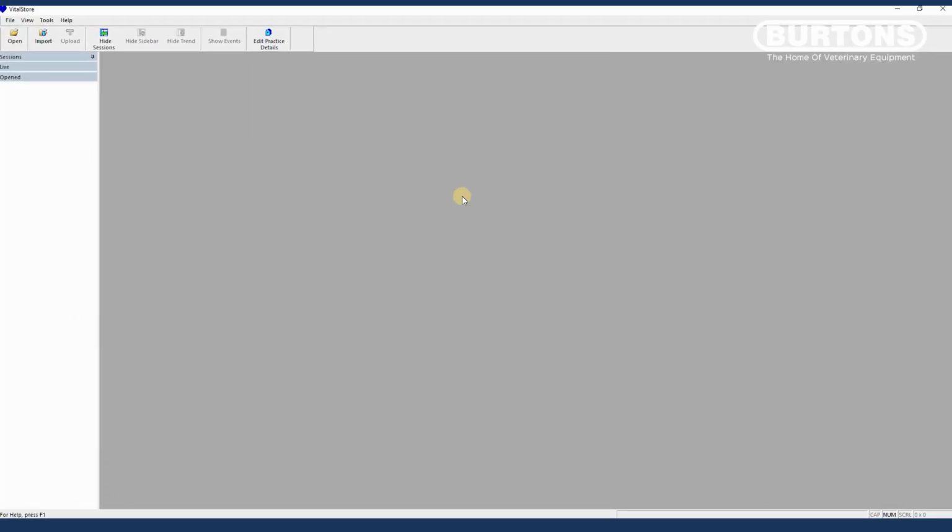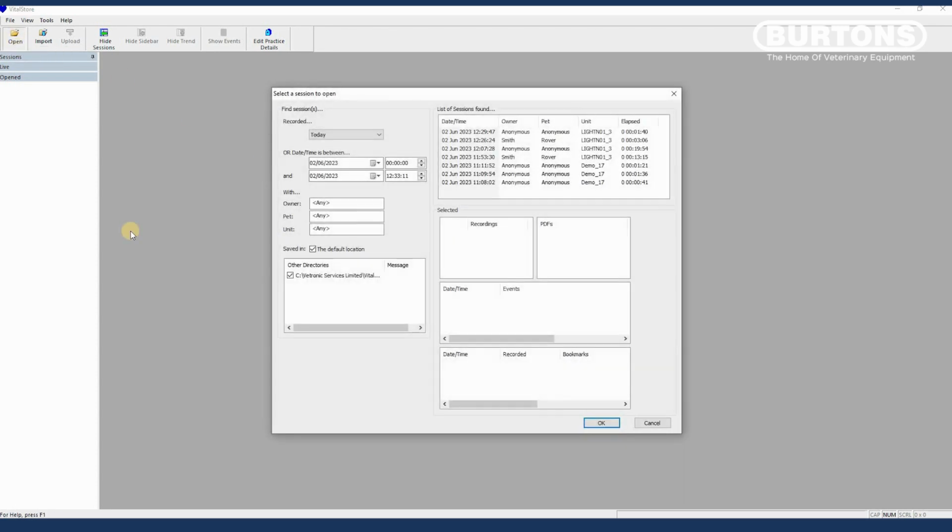And then very simply, it's an empty screen. You need to open a file to view it. So we click on open, and then by default we have all of the recordings for today. Here's one that I did today, Rover Smith. So I'm just going to open that up.